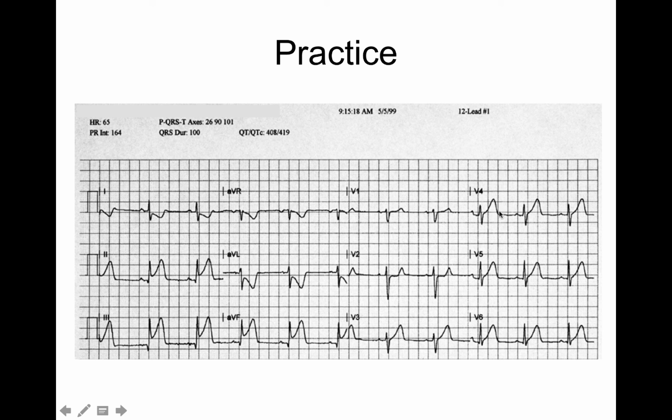So nothing going on in the septal portion, and the T wave's still high, but I'm not seeing an ST segment being fully elevated. So the only thing for this one, oh, keep in mind I forgot this, AVL and 1, AVL. So I have inferior wall MI with lateral ischemia, okay? Inferior wall infarction with lateral ischemia because it's down.